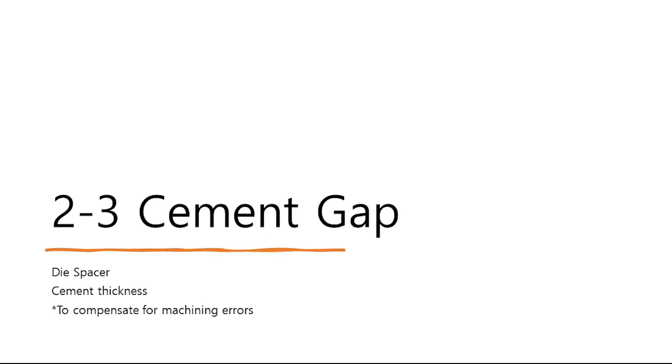You may know that cement gaps use die spacers to give cement thickness. Here, we'll explain cement gaps that consider the characteristics of the milling method. I've been experimenting with cement gaps.